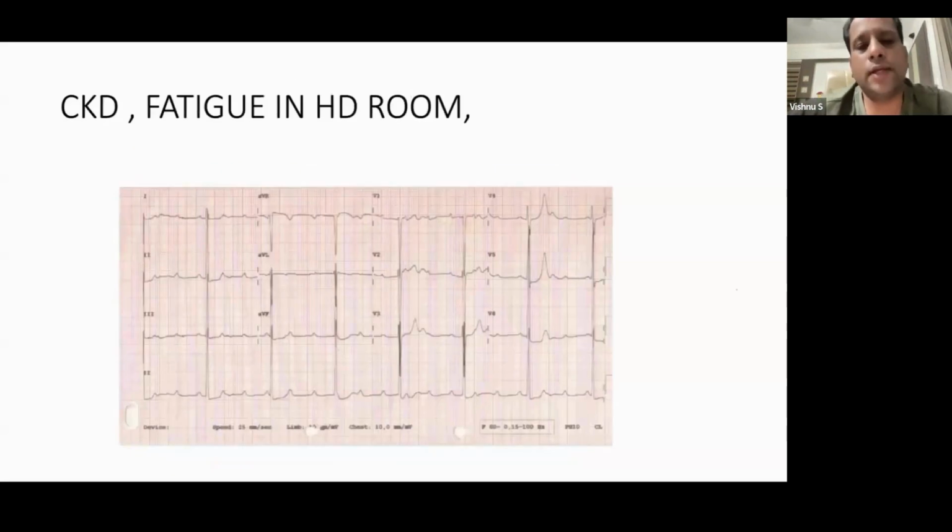This one I think is very easy to diagnose. What is the ECG abnormality? Two ECG abnormalities are there. Is it reversible or not?